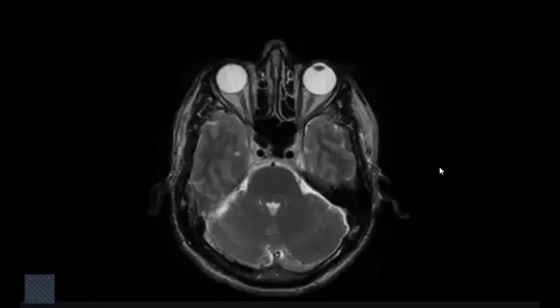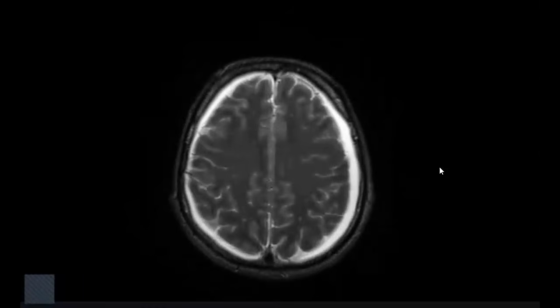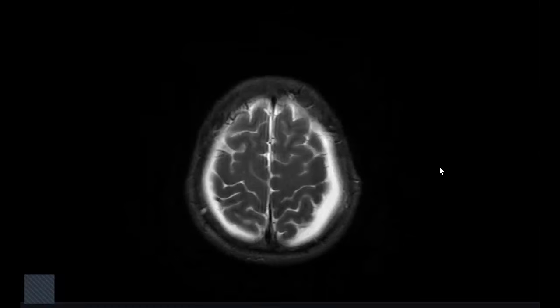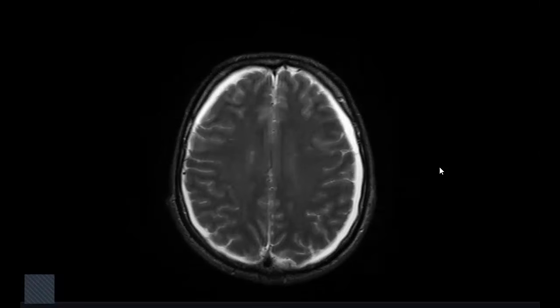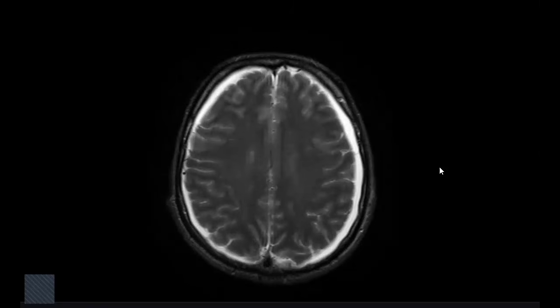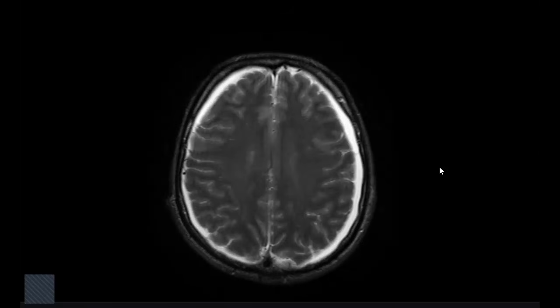Sorry, it's jumping. Wait, scroll slowly. Don't scroll one time. I can appreciate that there is evidence of bilateral hyperintense, but this appears to be also bilateral collection. Where is the location of this collection? It extends through both cerebral hemispheres, frontal, parietal, and occipital. Where is the exact location? Extra-axial, subdural. It appears to be hyperintense signal.